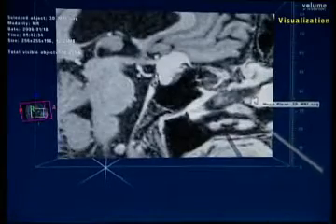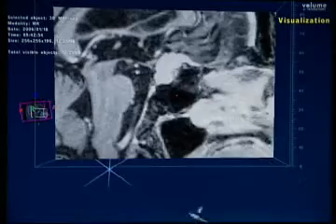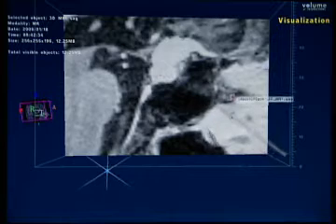So the meningioma is sitting there, reaching a little bit onto the planum sphenoidale, then the tuberculum, and into the pituitary fossa a little bit. And the pituitary stalk is there, right? So we can see the contrast enhancement is pretty much identical, but probably this is the pituitary gland somewhere there, and the meningioma is on top.